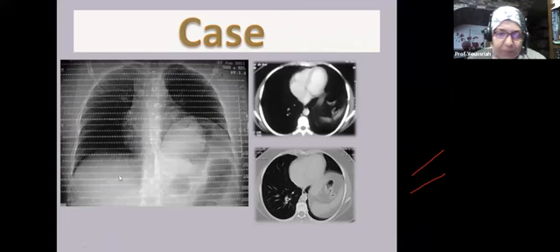Now, let's see here. This is a post-operative case. As you can see, there is evidence of median sternotomy in the scanogram, with marked elevation of the cupula. The mediastinum is central. There is no mediastinal shift. Okay, and there is a hernia here. There is elevation. There is viscera inside the left hemithorax, but it does not abut the wall. Okay, it's only the viscera because it's higher in level, as you can see. There was no mediastinal shift.